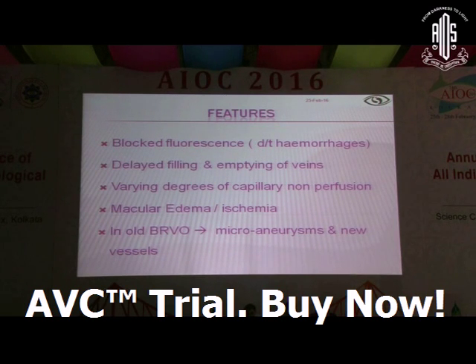So in the initial phase, when you see an angiogram, the immediate presentation would be a blocked fluorescence because of the presence of blood droplets on the surface of the retina, that is pre-retinal hemorrhage, and a delayed filling and emptying of the veins. As we have already been told, usually in 20 seconds the AV circulation time would be over, but here it would be further delayed. In a later phase, you might note the development of new vascular response in the form of microaneurysms or development of new vessels.